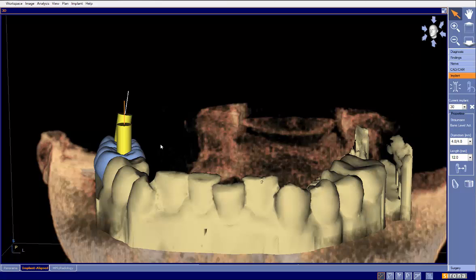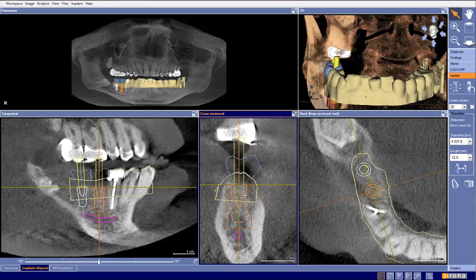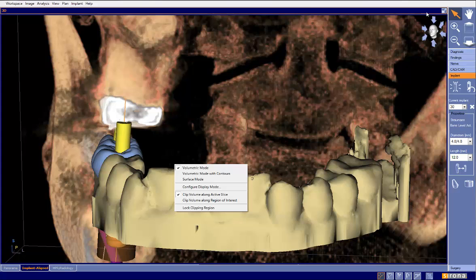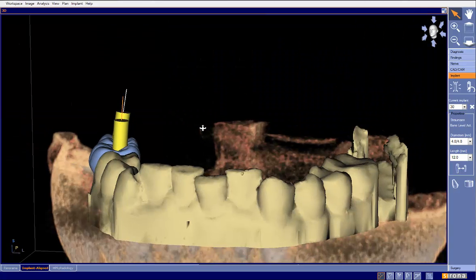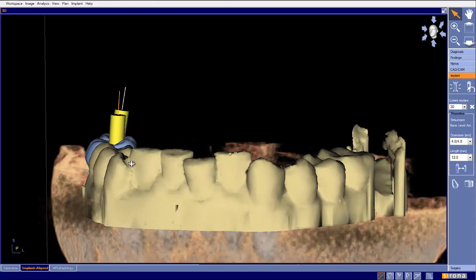And we could technically even tilt it some more, like so, and then bring it over like this. That would actually give us something a little bit more natural with the natural alignment of the teeth there.